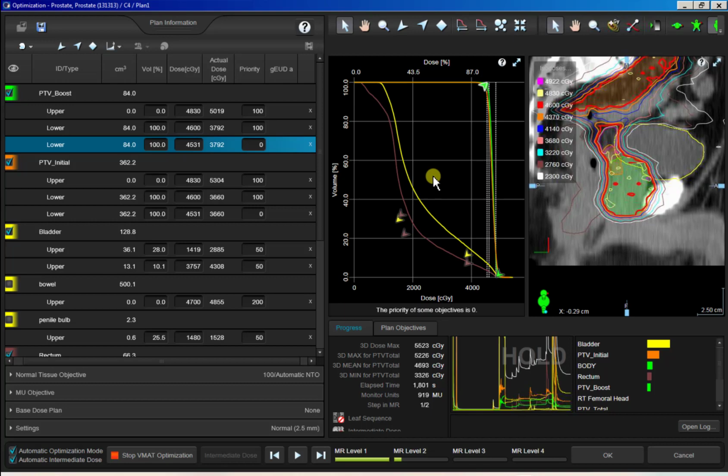You need to test the system, and if you really test it and push hard, you'd be surprised at how good of plans you can get. And if you give it time, if you pause at the right time and let it think, you can get some really good results.